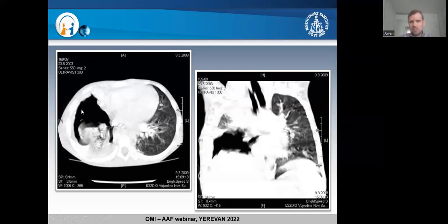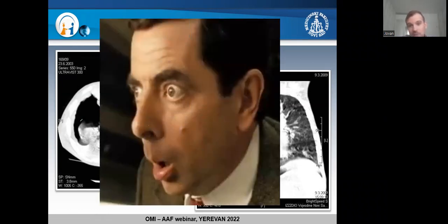This patient doesn't have more than half of a right lung, and you said that this lung ultrasound is perfect. If you pay attention, in this patient you will see a bunch of A lines. There will be no lung sliding because there is no lung to slide, no pleura to slide, right? So your face might look like this after the CT examination.